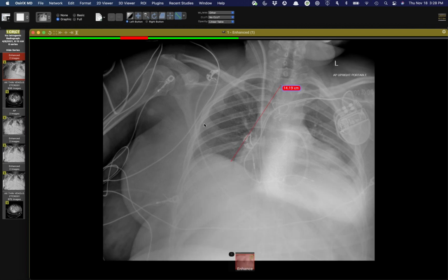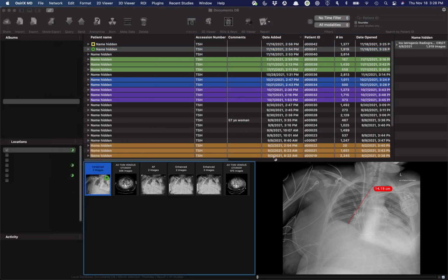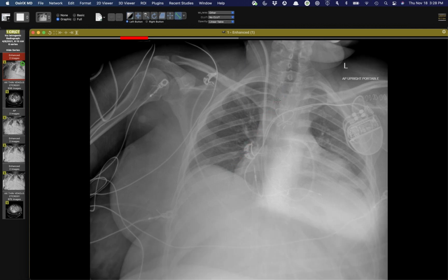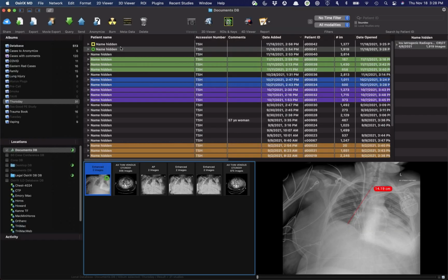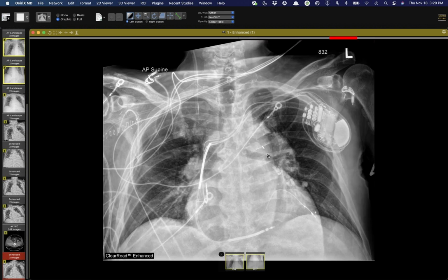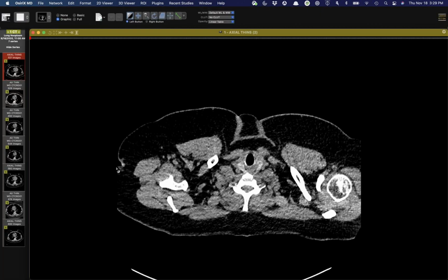So, Travis, with the axillary approach, intra-aortic balloon pumps, what I think I've noticed is the little metallic markers in general tend to be a little tilted. Like they're not straight up and down. Is that something you noticed? Or is it just me? Yes, I agree. But if they do position them into the descending aorta, like this other one that I showed you on that last image, this is headed down the descending aorta, so it's more vertical. Yeah, yours are definitely abnormal. I'm just saying in general, it's a clue that they're axillary. Yeah. It's a little tilted.